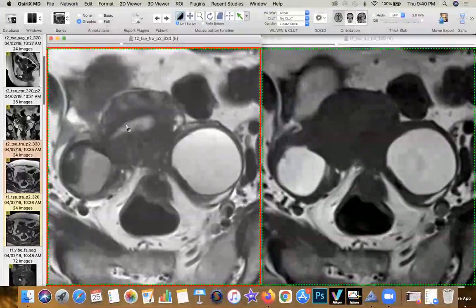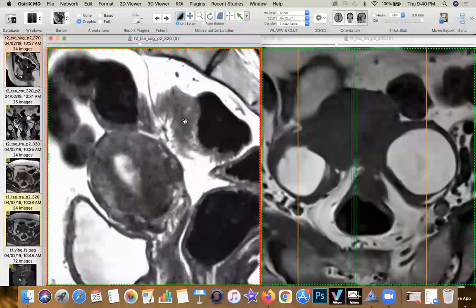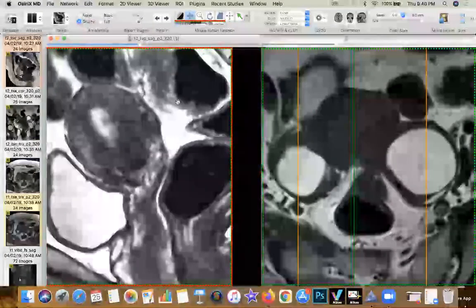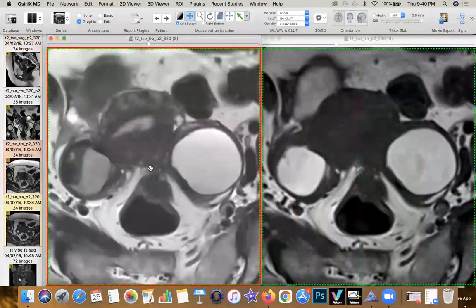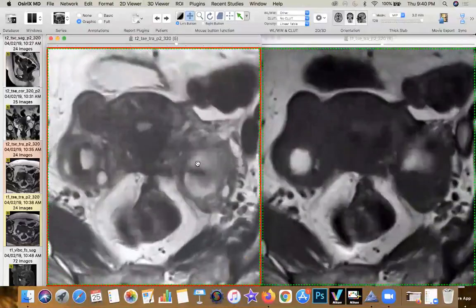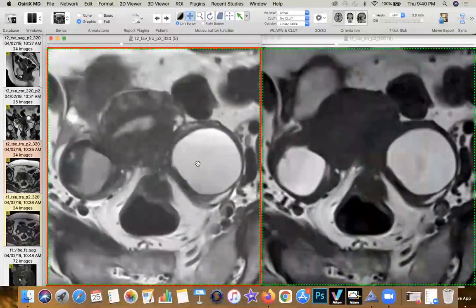So therefore, now what do you have? You have a patient with endometriotic tissue along the posterior serosal surface of the corpus, the mid cul-de-sac, subserosal infiltration, obliteration of the rectouterine pouch, both the ovaries plastered to the uterus itself, and they all contain ovarian endometriomas. Both the ovaries contain ovarian endometriomas. Now, what else are we seeing in this patient?